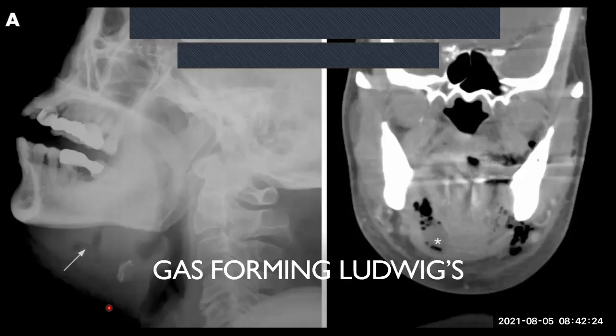About the most you may see, and it's not an X-ray diagnosis, is gas again, all right? But remember, whenever you see gas, there is an organism, generally an anaerobic organism. So always remember that. This is just a CT of the same thing. If you can't see the tongue too well here, but if I brought it a bit forward, then you could have seen it, okay?